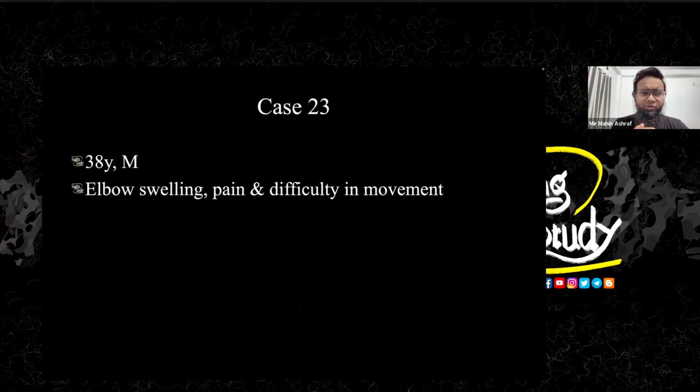Now, case number 23. This is a 38-year-old male patient who came with an elbow swelling, so at last a musculoskeletal case. There was pain and difficulty in movement, so elbow swelling is very common. We have shown you a musculoskeletal case. I think it was supratrochlear lymphadenitis.